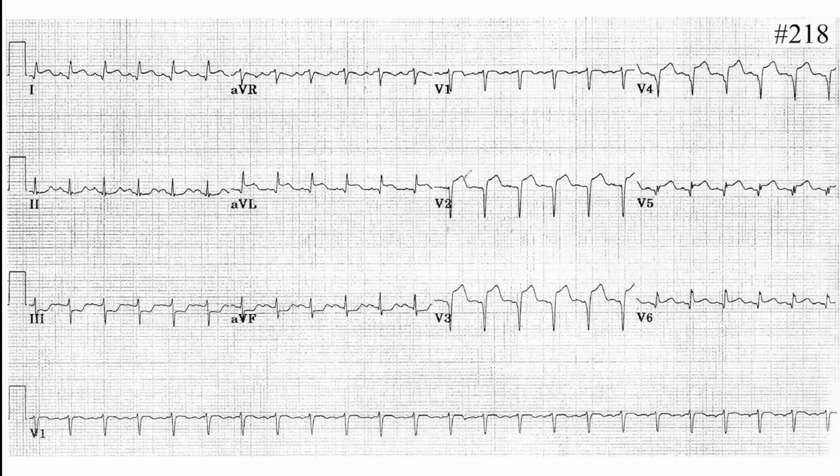In lead 3, V2, V3, V4, V5. I would say V6 as well. In lead number 1, well, I don't think so. Okay. And ST elevation as well, indicating? Acute MI. What is the location?